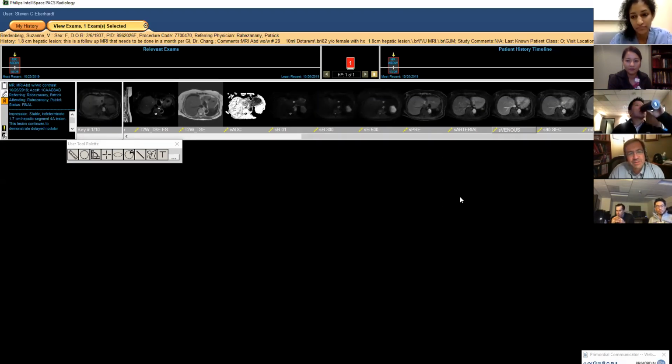In the same conference, we had another case where it was a larger lesion in a patient with a cancer history, a more heterogeneous appearing lesion, both on pre-contrast and post-contrast images. So it was kind of a compare and contrast, with this one being indeterminate but tilted a little more towards something not so malignant, whereas the other one was indeterminate but worrisome for malignancy. I don't have a biopsy on either one, but that was my recommendation for both.